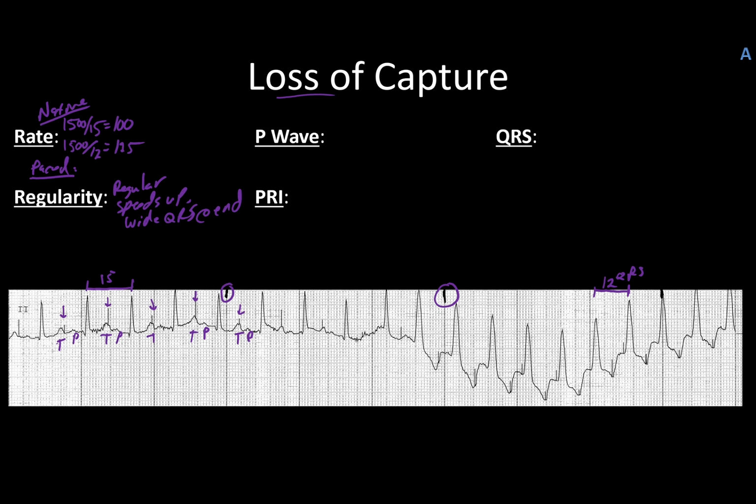As we go forward and get to about the middle to last portion where our rhythm changes, you'll notice that those spikes are still happening, the spikes are still happening around where the T wave is at. And in fact, they start landing right smack dab on the end of the T wave itself. And then it gets really interesting because you start seeing two spikes, one that's on the T wave and one that's associated with the QRS.